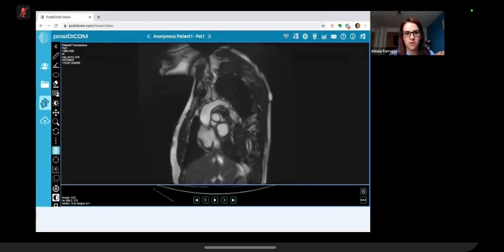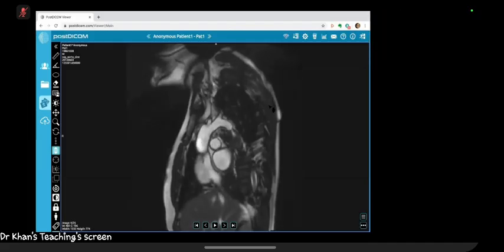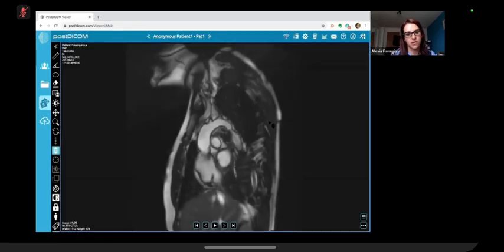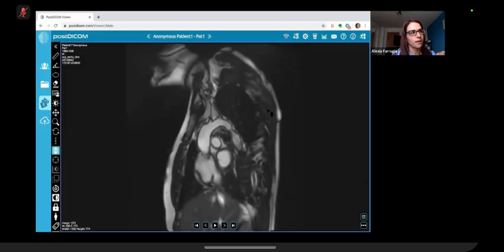Okay. So this patient had an MRI. Focus on the aorta, so follow it from its origin, across the arch and down. Descending thoracic aorta. And I'm going to play the cine images for this patient. Ignore everything else, and look at the aorta. And this patient is a young hypertensive, 33 years old. Do you think you have seen abnormality?